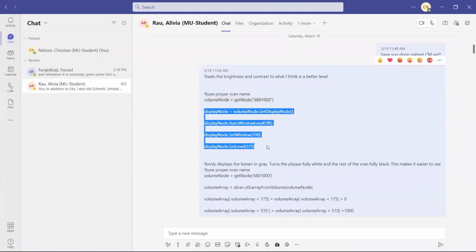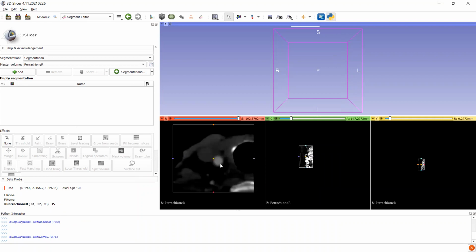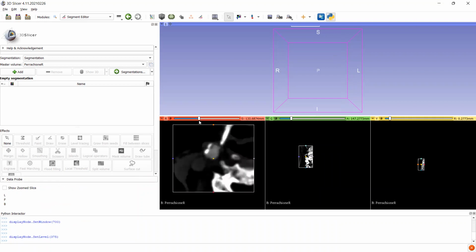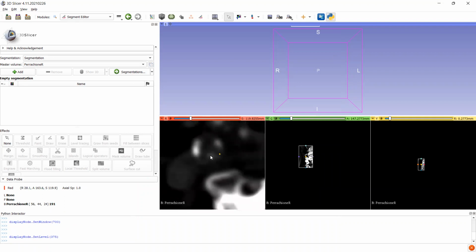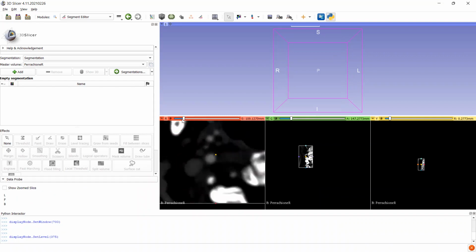Now, once you define the volume, you can copy and paste the rest of this. And you see now here, the artery is much more self-evident. You can see right here, this is probably the narrowest spot. This area is the only flow lumen, probably in the entire artery. The artery should be about this size. So you see that's about 95% blocked up, if not more.